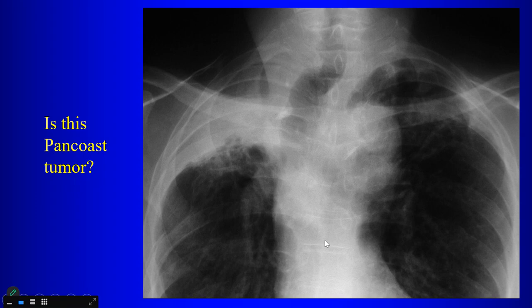Are there changes in the left apex? Yeah, there's some reticularity here in the left apex too, so there's some abnormality there, but the trachea is deviated, the hilum's elevated, so that looks like volume loss. These lucent areas represent what? Honeycombing? They're more central, so how about bronchiectasis?